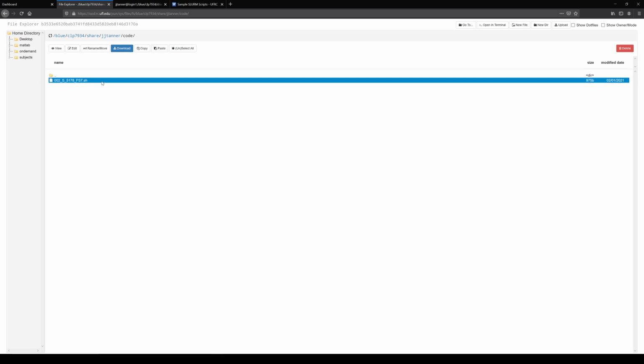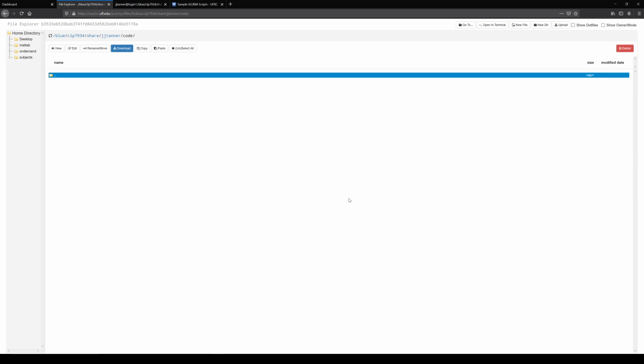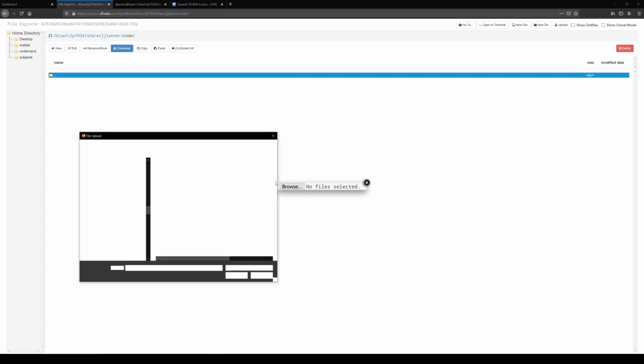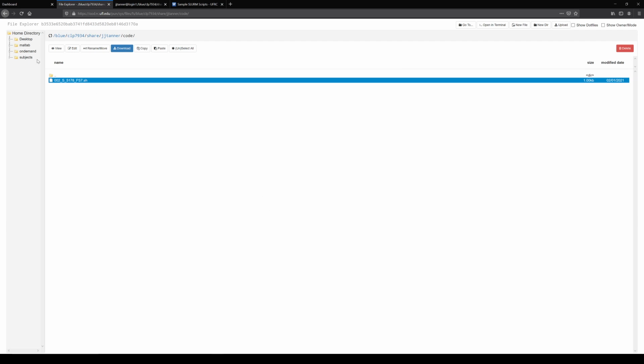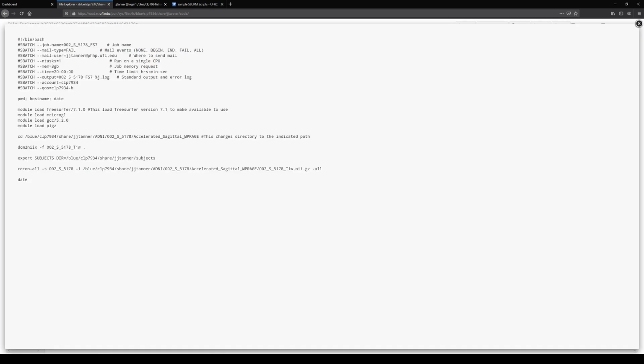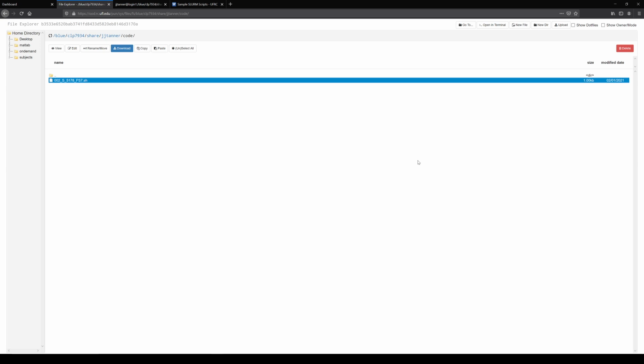It would have been fine if I hadn't edited that because I have an account, but let's just upload this again. As I said, there can be some issues. Let's just view it. There's always issues with image processing. And this looks good.